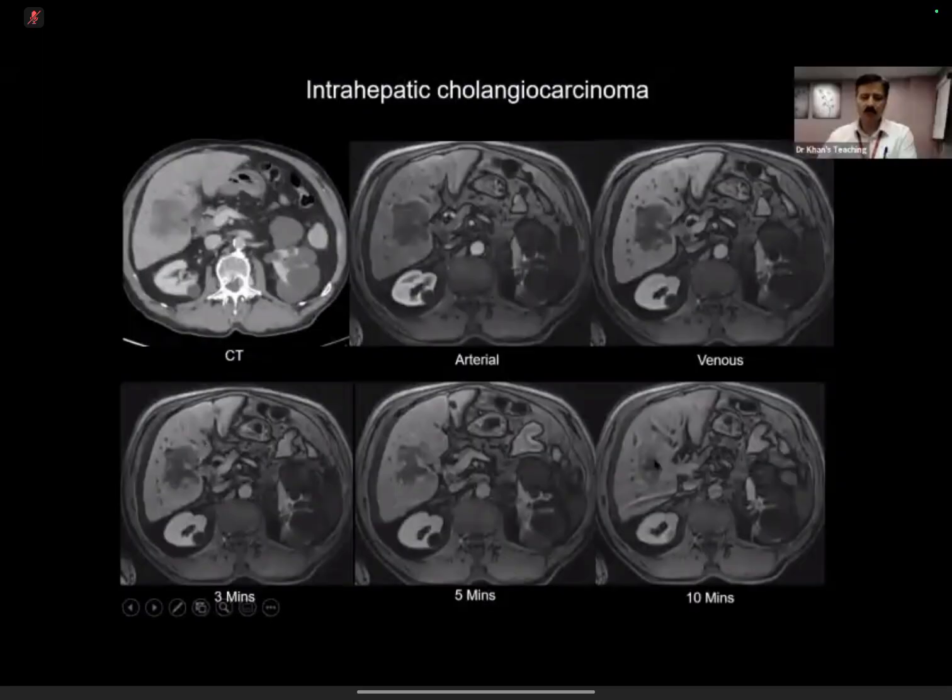This is fibrosis. In hemangioma, one take-home point will be that the periphery of the lesion shows nodular enhancement. Number two, it will not be continuous enhancement. There will be some gaps there. Another point to remember is that in hemangioma, the signal intensity of the enhancement is equal to blood pool.